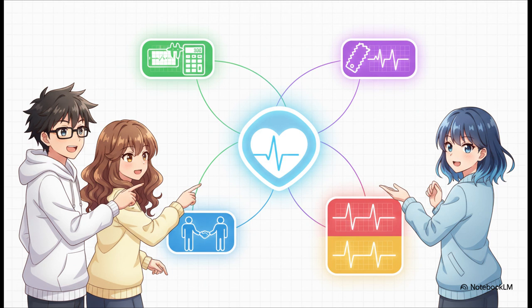For the axis, what do you ask? Are they shaking hands for right axis deviation, or are they enemies for left axis deviation? Then you look for those patterns. See a sawtooth? That's atrial flutter. See those tall peaked T waves? That's hyperkalemia. Flat T wave with a U wave? Hypokalemia. Stick to that system and you'll never get lost.